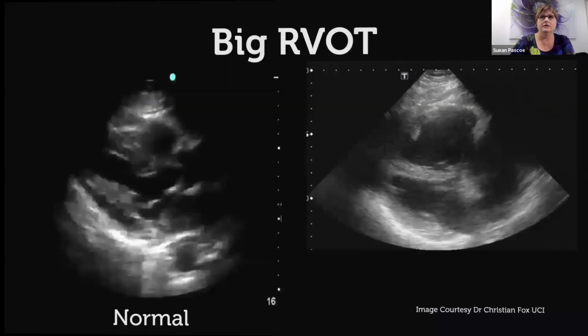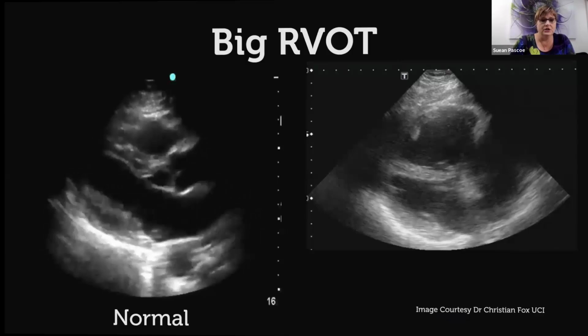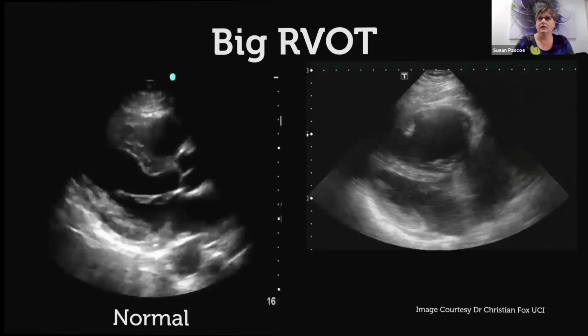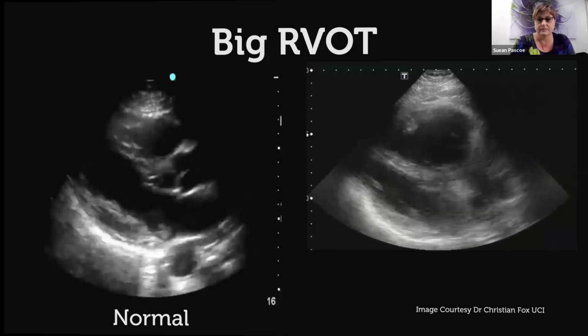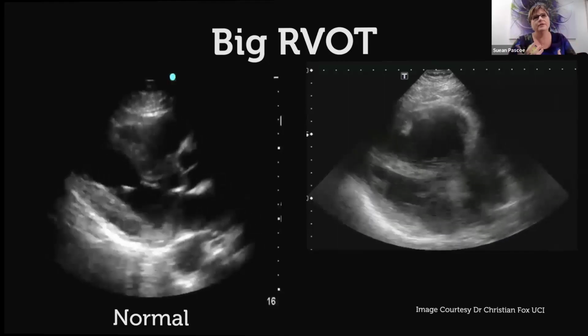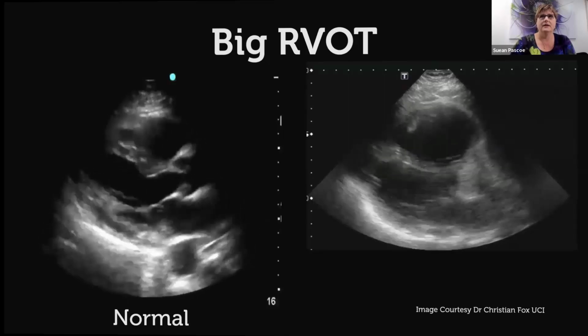Now, if they're not equal in size, then that starts to tell us a story about what's going wrong. So, first problem that we can have is that the right outflow tract is enlarged. And so we can start thinking of what are some of the reasons for why the right outflow tract might be enlarged. So here we have normal on the left, and on the right image here, we have an enlarged right outflow tract. Now, what are the sorts of pathologies? Maybe it's a pulmonary embolus, other sorts of things. You've worked through those questions about what causes enlargement of the right outflow tract.